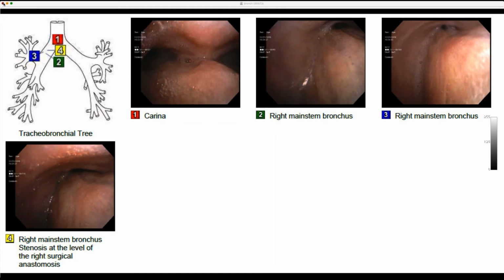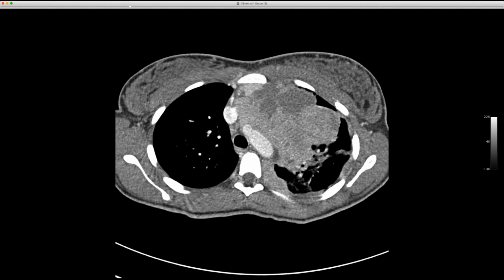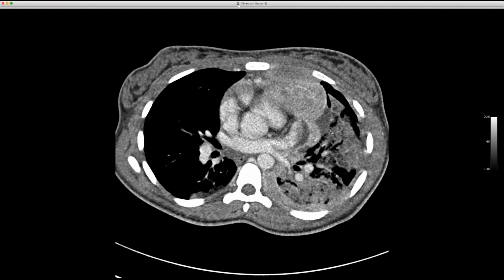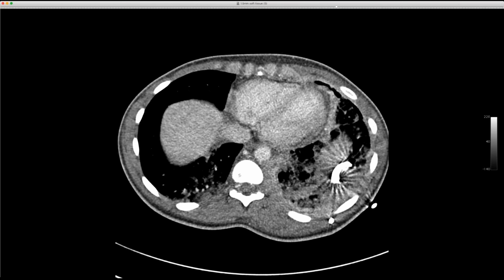This is an impressive case because this is a diagnosis we more often see in children. And let me show you here. So this is a young woman who presented with shortness of breath, fever, and a bunch of other systemic symptoms. Presents with this anterior mediastinal mass, pleural effusion. Underwent a CT at some other hospital, and you can see this really ugly, heterogeneous mass with some significant mass effect on the adjacent structures. And there's some consolidated lung down here that looks very unhappy, probably a post-obstructive infection, pleural involvement. There was a drain already in at this point.